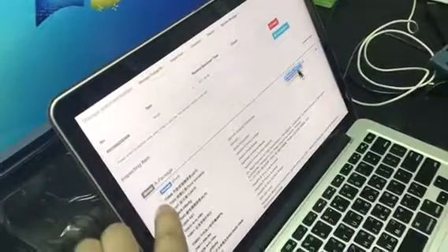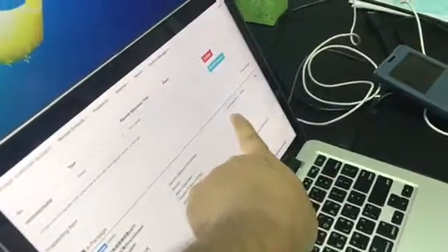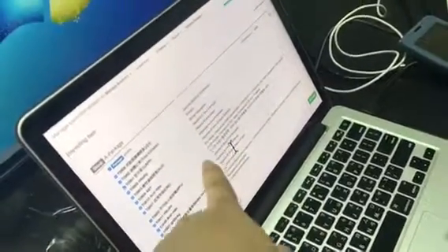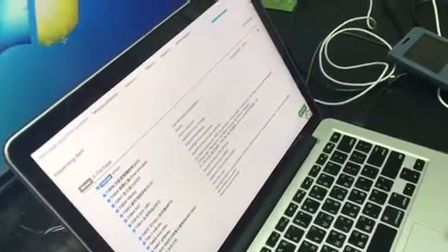And here you will need to choose which tube and what kind of test. Down here you will see for this tube, you have to go through all these tests, and then we'll create. Okay, so let's find this tube and search. So this is the tube awaiting processing today. So let's pick one, the one we just registered.